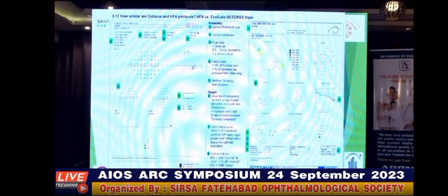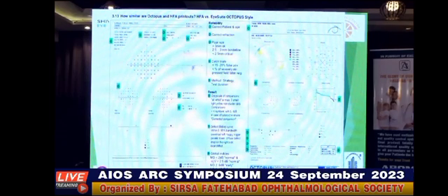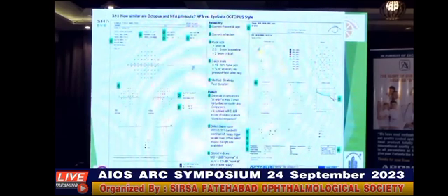Now let us see how similar our Octopus is to the Humphrey. The patient's name and age have to be entered. The refraction, pupil size, false positive and false negative catch trials, the test strategy, pattern, test duration and more can be seen here. The total deviation values are seen as comparison values in the Octopus. GHT in the Humphrey is depicted as the Bebie curve in the Octopus, and the global index called the mean deviation in a Humphrey is seen as the mean defect in the Octopus.